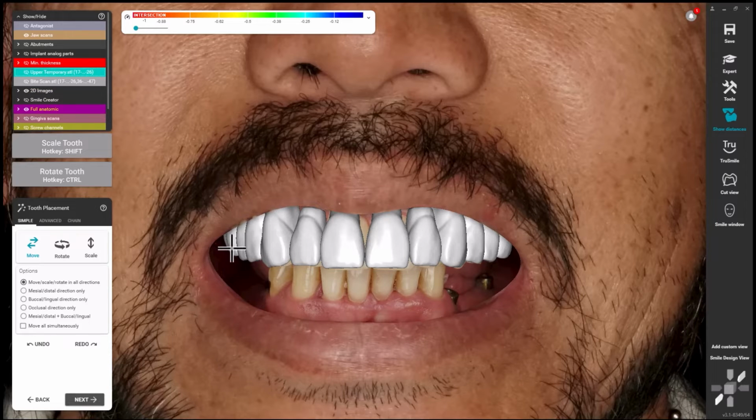All right. And again, this is where you can really get some fine tuning together. Make sure we get a nice smile view for our patient here. Okay.